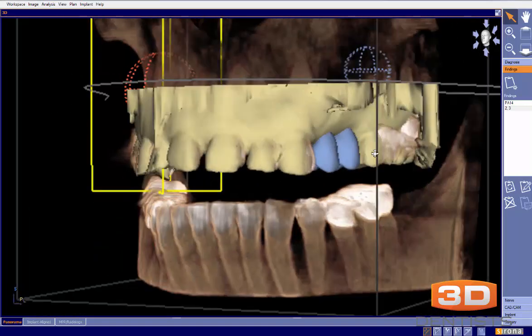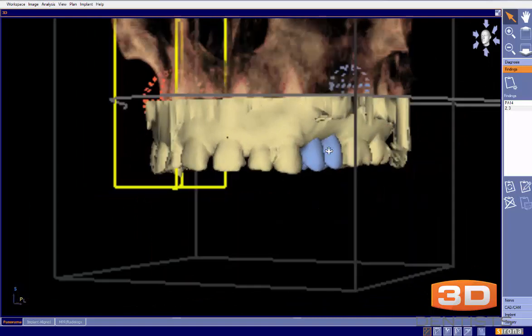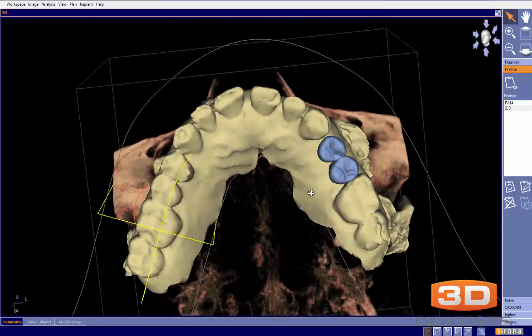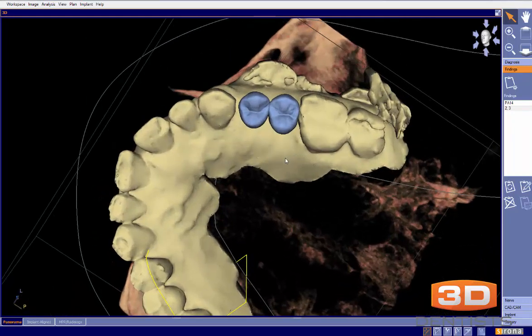The other thing that I would also do in this particular case is right click and clip along the active slice, lock it in place, and we can take a closer look here. Also here, I don't like seeing, unless this is our intention, this gap right here in our design. I would like to see our designs a little bit more accurate in that sense.